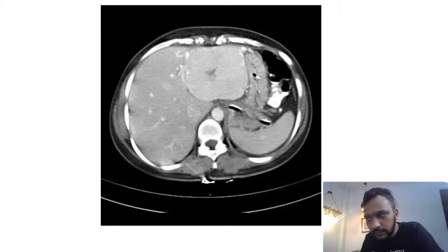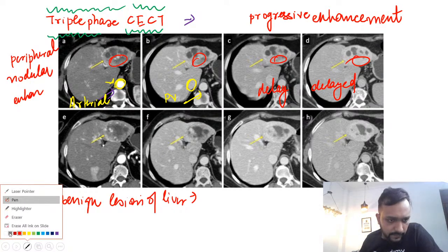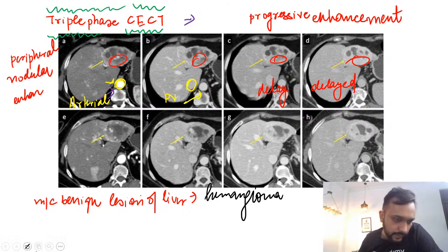So guys, this is a case of hemangioma, right? This is a case of hemangioma of the liver. Is that right?